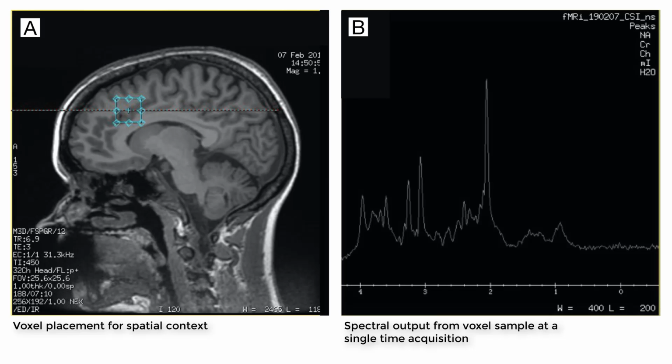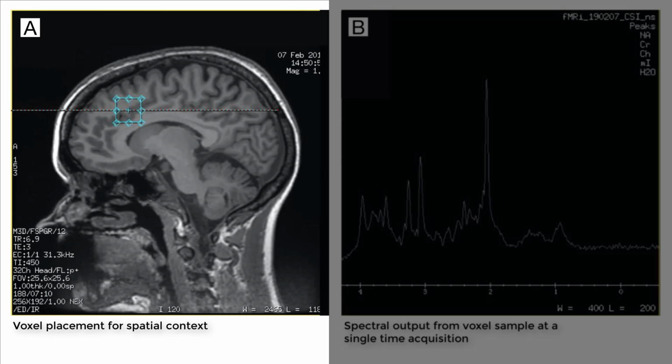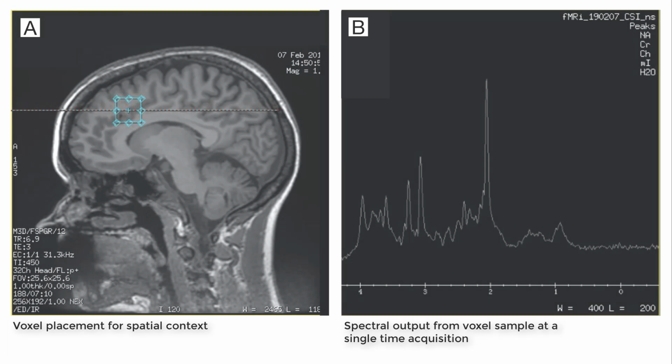and disorders. Current toolsets for MR spectroscopy analysis are severely limited and typically restricted to visualization of spectra for a single voxel for a single patient at a single time, as we see in this figure.